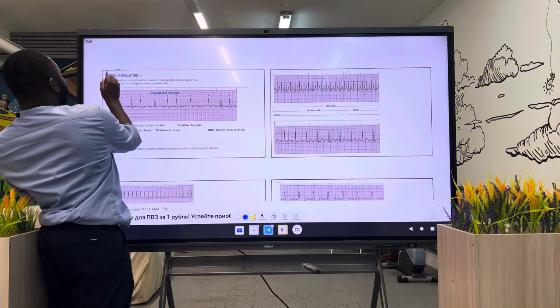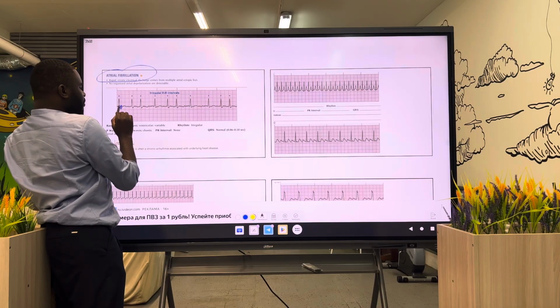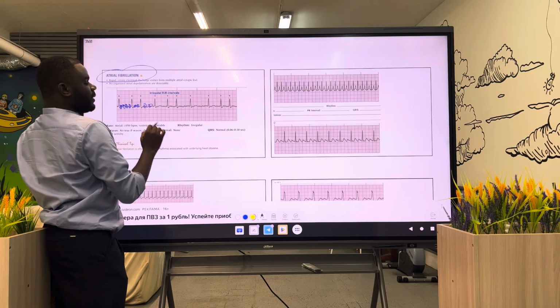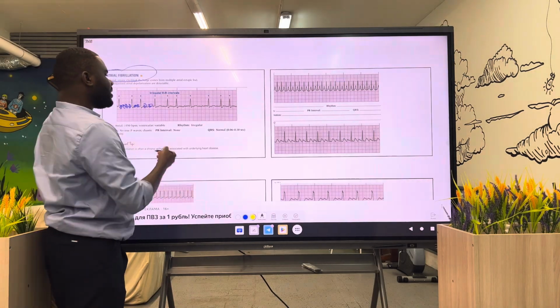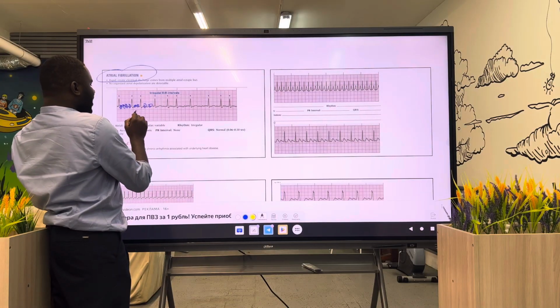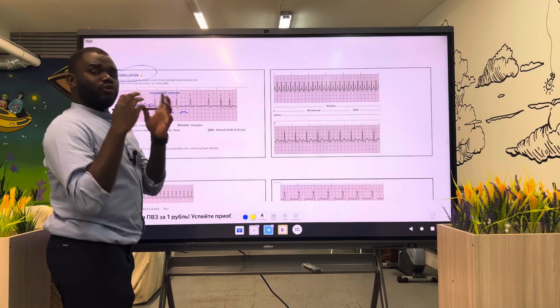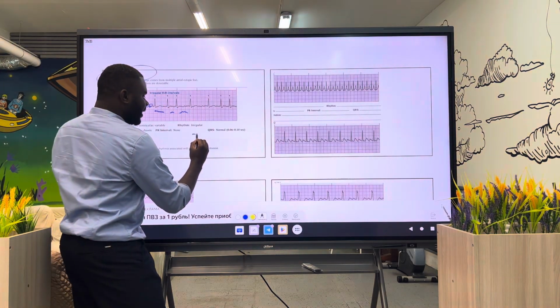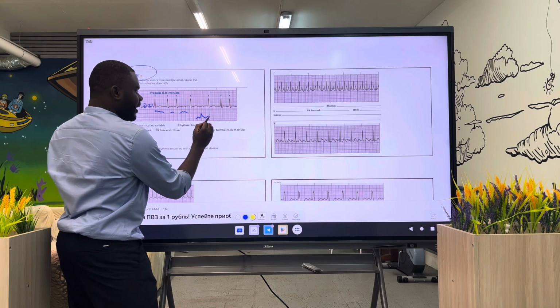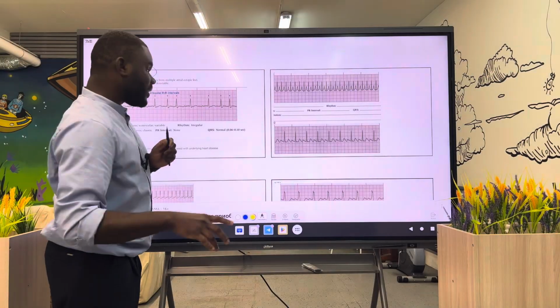So with atrial fibrillation that we spoke about, we have what? Because people might say, oh, this might be P wave, this might be P wave, this might be, this might be. You see how silly it sounds, right? It's not, obviously. Whenever you have this kind of wave, you can see that it's like a shaky wave. It's not even a full contraction. Normal P looks like this. It goes up, it comes down. But this one doesn't even go down before another contraction, another peak. So this is not a P wave. This is not a sinus ECG.